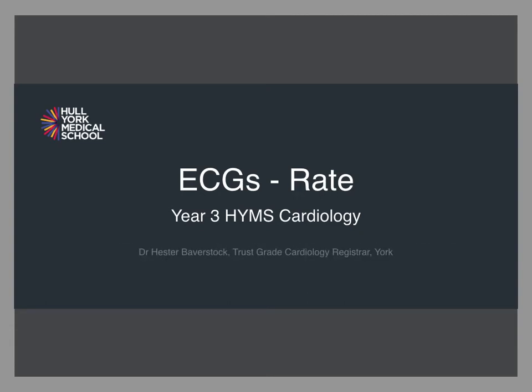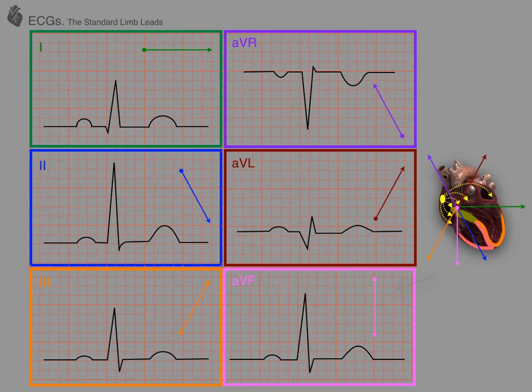So this will be a slightly briefer video than previous, and we will be discussing rate and how to calculate rate on an ECG. Firstly, just a quick refresher on what we talked through last time.